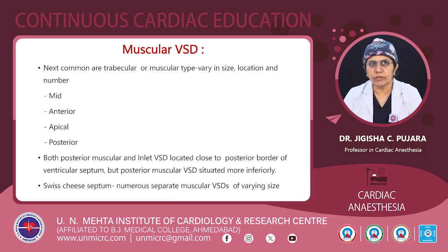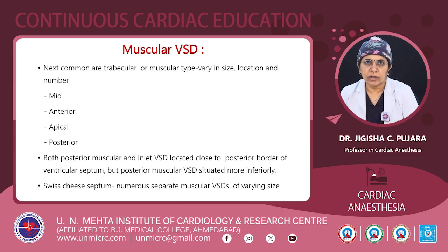Another is the muscular VSD. Next common are the trabecular or muscular type of VSD, which vary in size, location and number. They are divided into mid, anterior, apical and posterior. Both posterior muscular and inlet VSDs are located close to the posterior border of the ventricular septum, but the posterior muscular VSD is situated more inferiorly, while the inlet VSD is more superior.